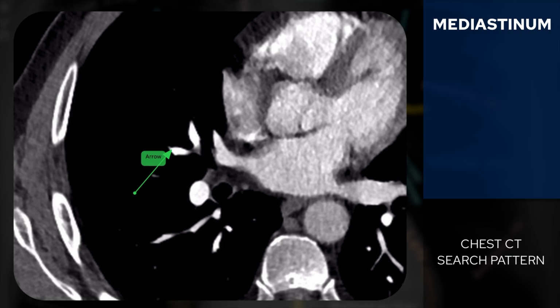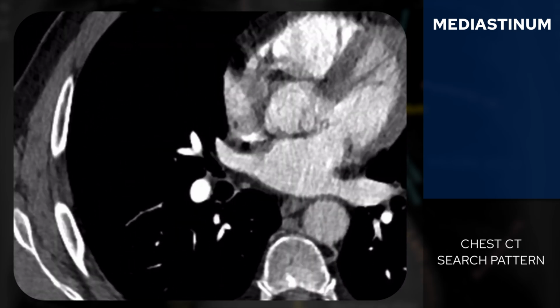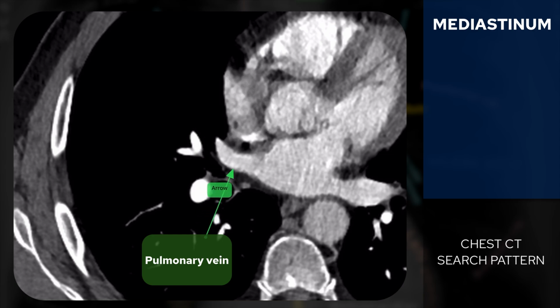I will then have a look at the middle lobe and also the lower lobe, and I'll follow all of those pulmonary arteries in turn on the right and then the left. So that blood then becomes oxygenated and it comes back into the heart via the pulmonary veins which sit over here. So I like to think of the left atrium as a spider with many flapping legs, and look to see if you've got at least 2 pulmonary veins draining in on each side. If you don't, those veins could be draining into the systemic system in something called partial anomalous pulmonary venous return.